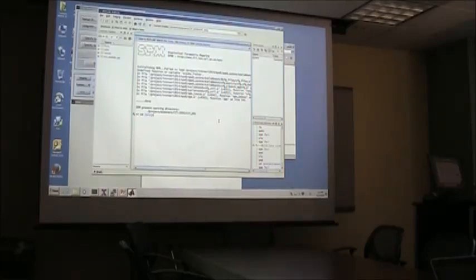The way these images are stored has actually seen quite some development in the last, say, 15 years or so, and they sometimes switch how the image exactly is stored. You have what they call 3D or 4D ways of saving data, but they're labeled the same. How would you tell just by looking at this? Yeah, it's very confusing. Okay, all right, thank you.